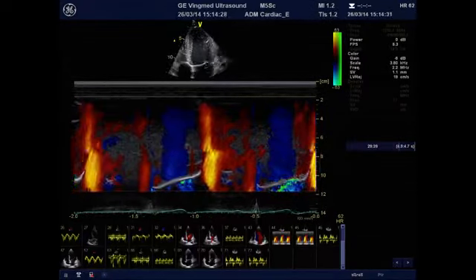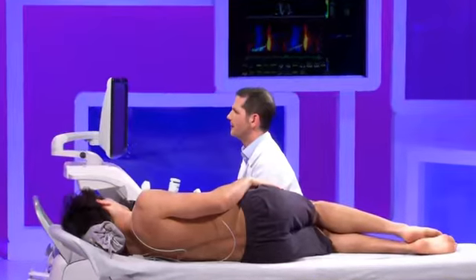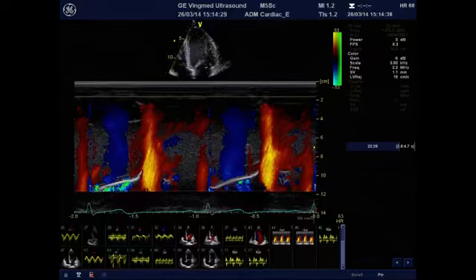And we will get something like that, which shows us basically the way the blood flow propagates in early diastole from the mitral annulus, which is here, you can see it closed in systole and opening in early diastole, towards the apex, which is here at the top of the screen. Now, you can simply measure the slope of this flow propagation, and this is actually Vp.